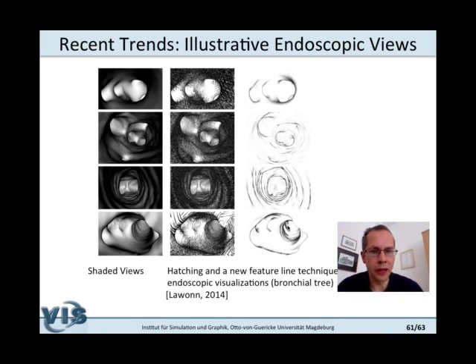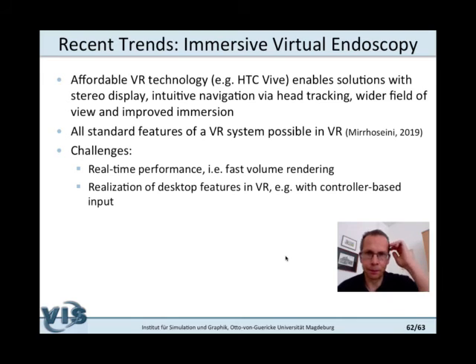So you may simulate illumination here as well, and then you have different areas. Some of them are shadowed, others are not, and the border of a shadowed region would also represent a kind of feature that could be shown with feature lines. These techniques are inspired, as you may imagine, from artists, from drawers, from people who professionally draw medical illustrations.